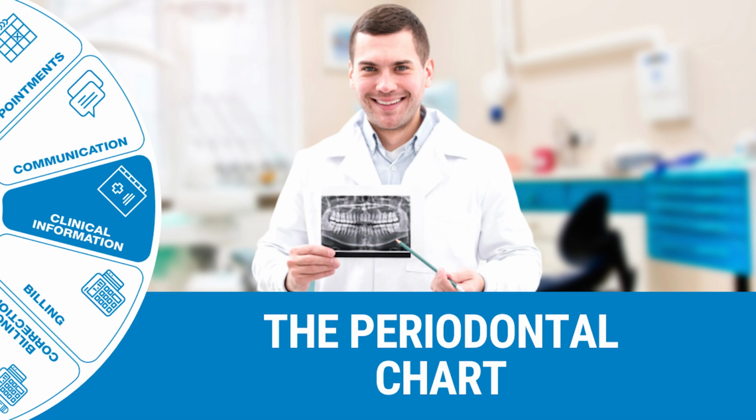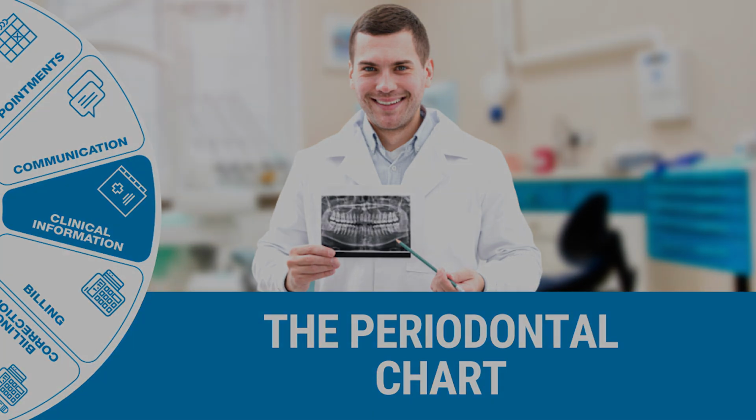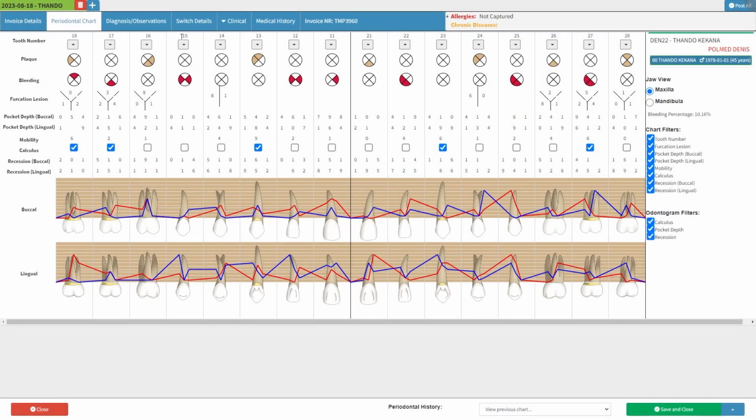Welcome to this tutorial video. The goal of this video is to show you the periodontal chart. In this video, we will start on a periodontal chart screen. We will first take a look at the various views and filters you can adjust on the periodontal chart.